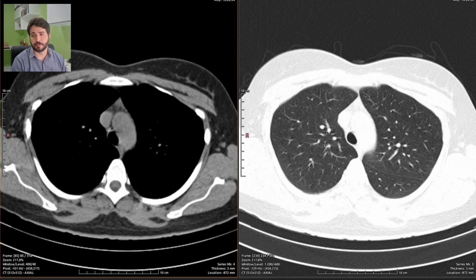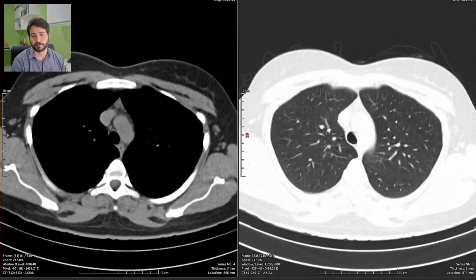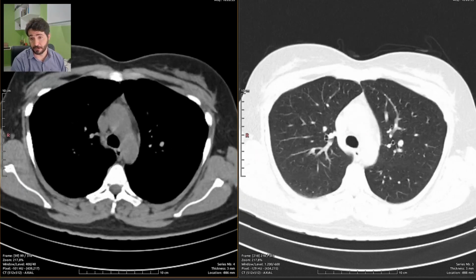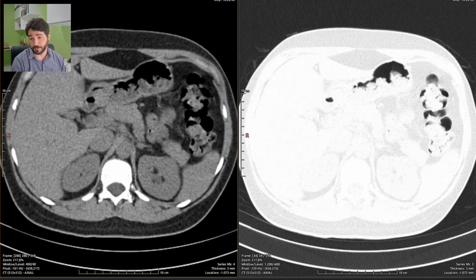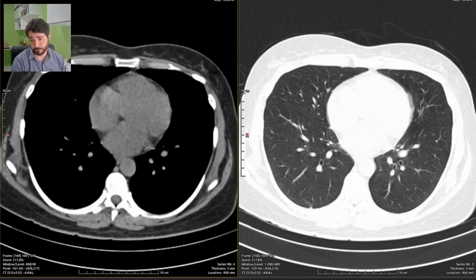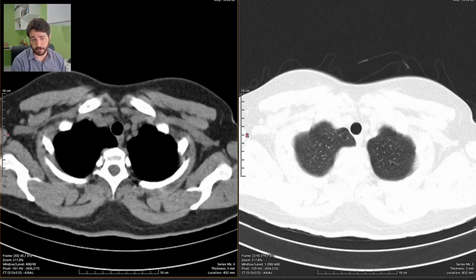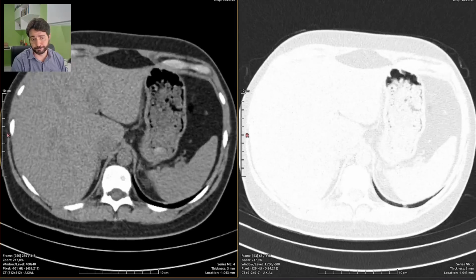And axillary regions are okay. Breast tissue seems symmetrical. We don't really expect to find much here because it's really not supposed to be anything really. Physical exertion should lead to tiredness. But anyway, yep.